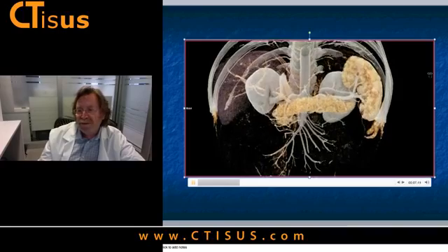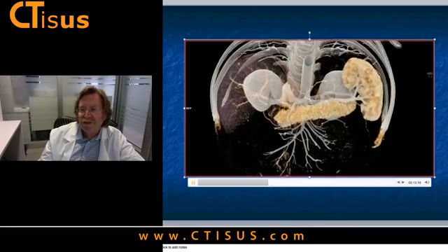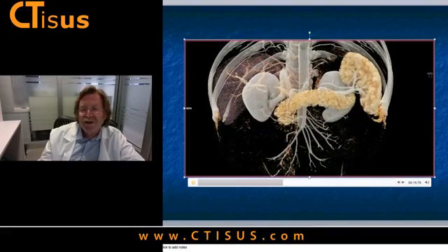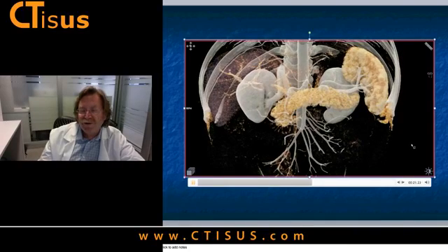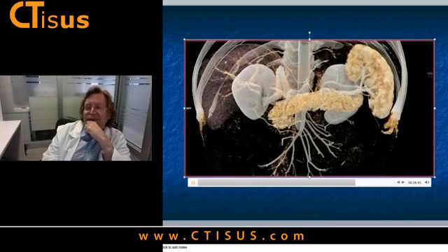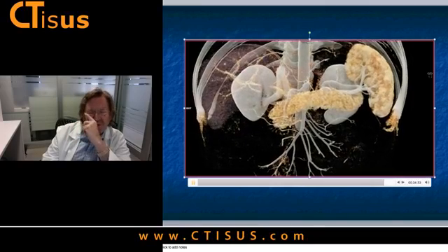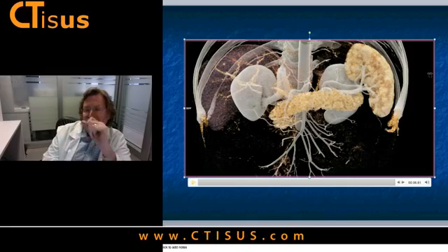But here's another same case. Look how nice that pancreatic texture looks. Look at the vasculature. Look at the spleen, the feeding vessels. And again, look at the mapping. One of the things we are working on for deep learning in detecting pancreatic cancer is looking at the mapping of the gland, looking at textural changes. And I believe that textural changes are seen before a mass is seen. And can we find the normal versus abnormal? And that's something we are looking at very, very carefully. And I think something that we will find to work. So that to me becomes very, very important.